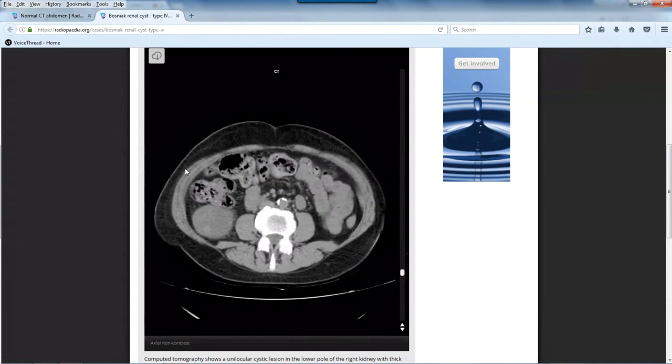And then remember I told you the 3 muscles that are sandwiched together on the lateral abdominal walls. Those are your external and internal obliques, and then all the way in here on the inside, the transversus abdominis, which is the medial layer of the muscle just on the exterior of the abdominal wall. Okay, so that's the sandwiched 3 muscles, the external oblique, internal oblique, and the transversus abdominis.